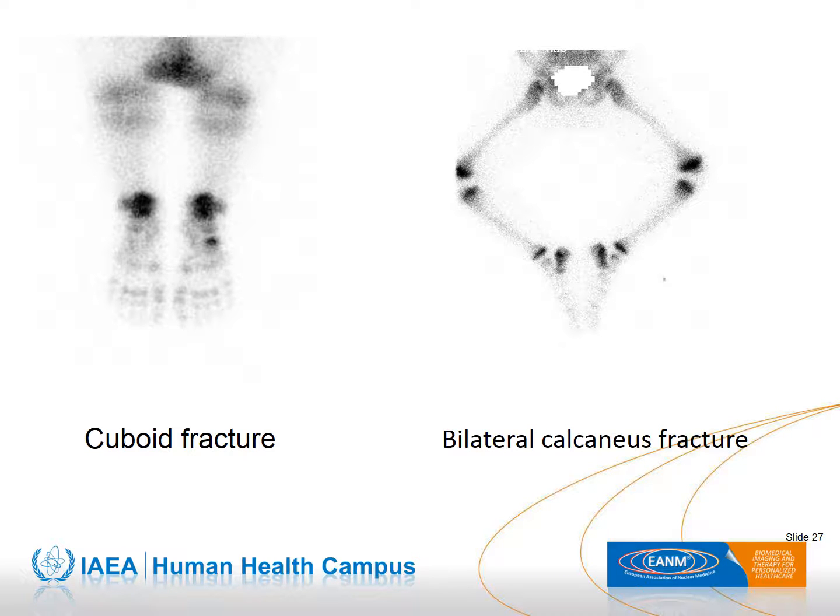Other fracture sites are frequent in the limping child, particularly fracture of the cuboid bone or calcaneum. The traumatic event cannot always be identified, as children can't be watched all the time.